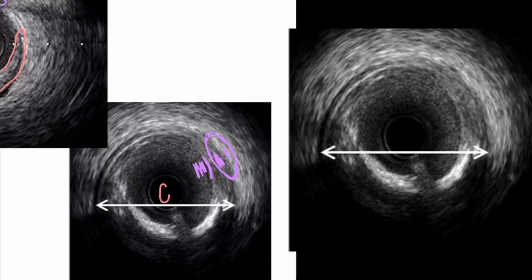So I know that this is probably plaque of some kind, the end of the media, and then, sorry, I know I'm just drawing all that in purple. That might not be helpful. Let me do it in the laser. So lumen, intima, something else going on, end of the media, start of the adventitia. So if I traced where I thought this black was, that's why it's important to really understand the media, because if you measured here, you'd severely undersize that stent. But then we lose all our layers out here, right?